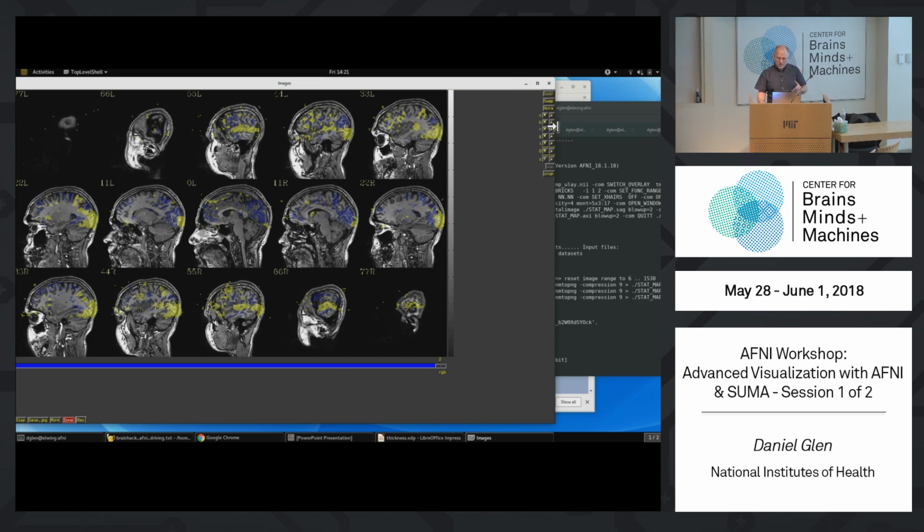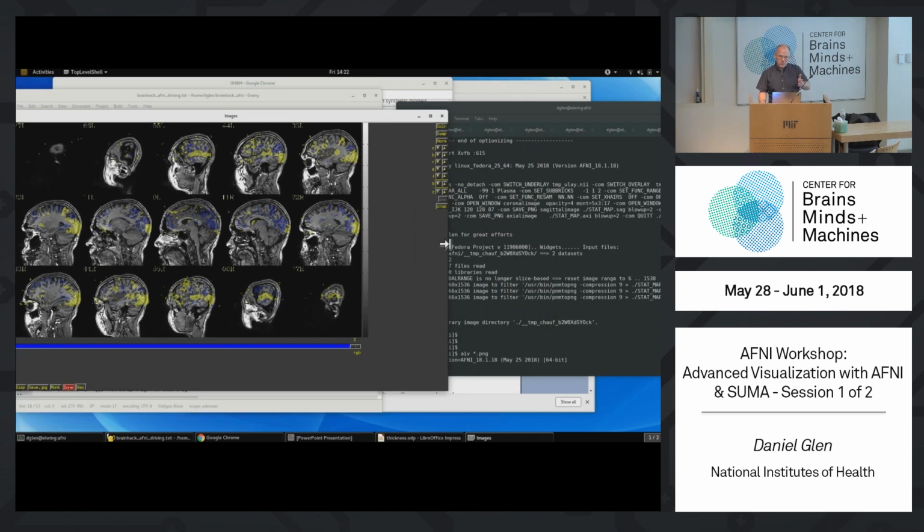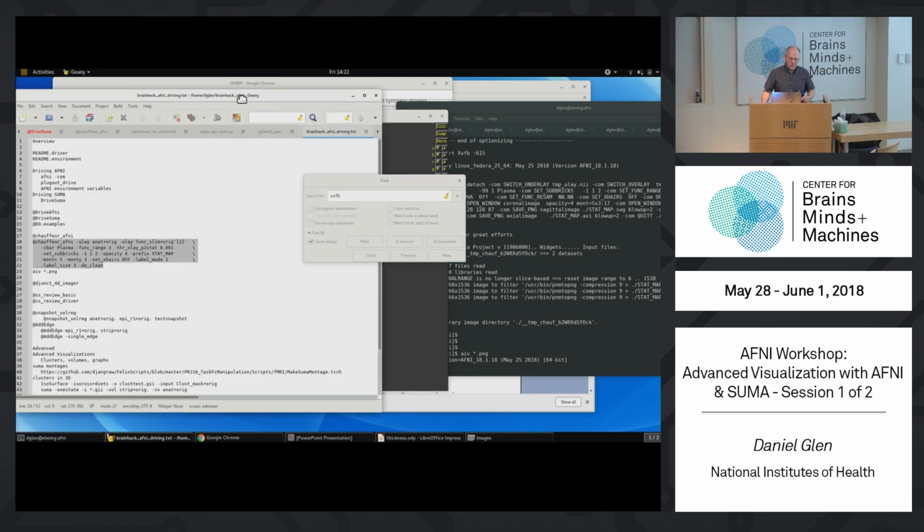They're fairly short commands, but I have just a text file that is not in the distribution for the class. It's just a kind of last minute addition here. So I can make this available too. It's a very simple program. It's setting our color scale to that particular color scale too.